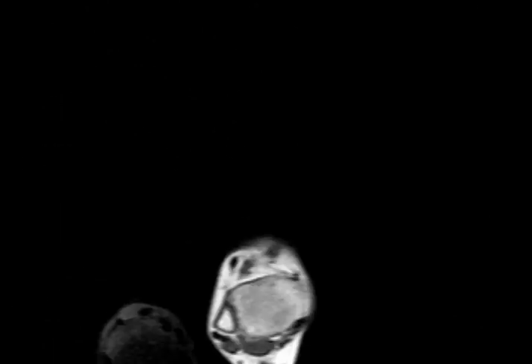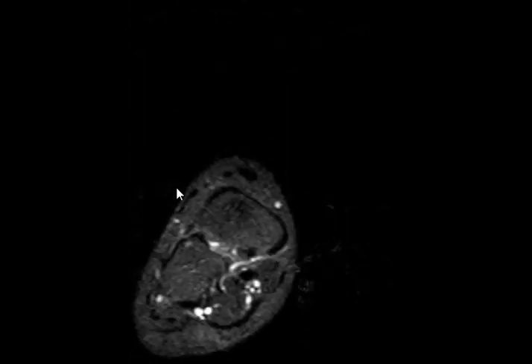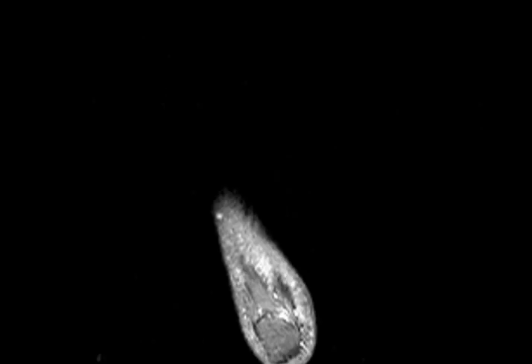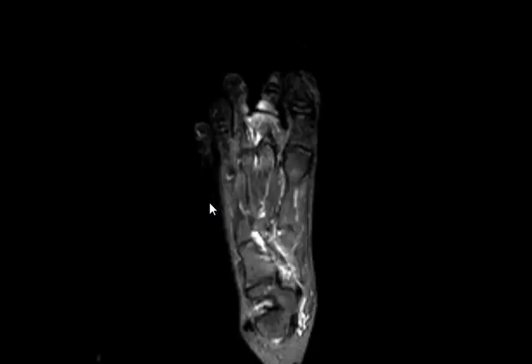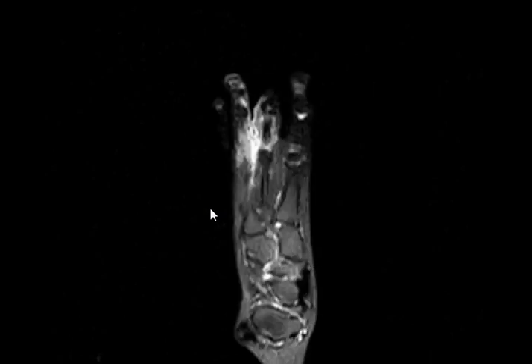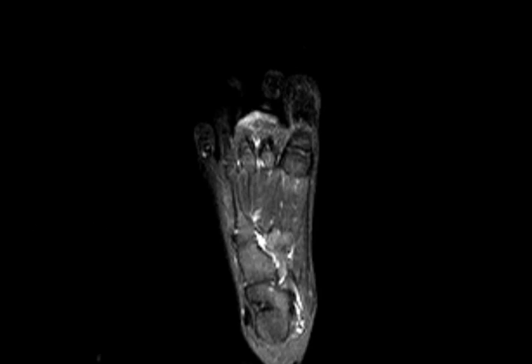راوينا بعد images. هذا السيرفي عفي. يلا ايه قلبي خلينا نشوف. شوي صعب يعني. صعب. اشتري هيستوري ماله؟ شو مدري انا هسه شفت الكيس مثلك. فيميل أو ميل؟ female 14-year-old. أيوة شو؟ ايوه شنو الهيستوري؟ ويش مدري والله ما ادري.